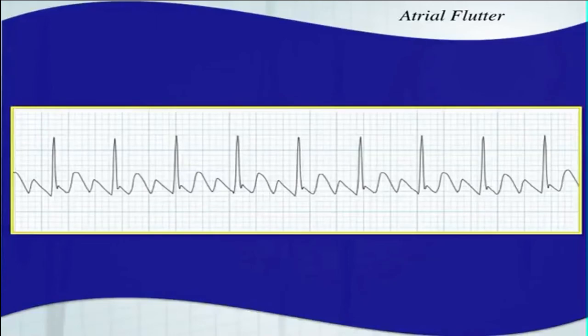Here's another example of atrial flutter, and again, you would have to continue that F wave that's hidden in there. That's what makes these so hard to identify, is these F waves will just become hidden. Sometimes you have to look at them upside down. If I flipped this, you could see this sawtooth pattern a little bit easier than covering up the QRS complexes sometimes.